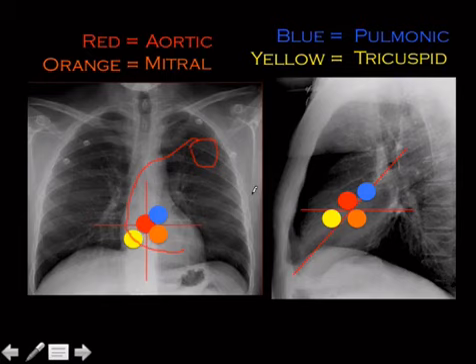And also, if you can remember the course of the pacemaker lead, that helps me remember where that tricuspid is. Remember, pulmonic on top, tricuspid on the bottom, PT, physical therapy. PT, pulmonic on top, tricuspid on the bottom, aorta in the middle. Start with the alphabet. A's the first thing you say, and then mitral is the other one that you see all the time, and that's where it's at.